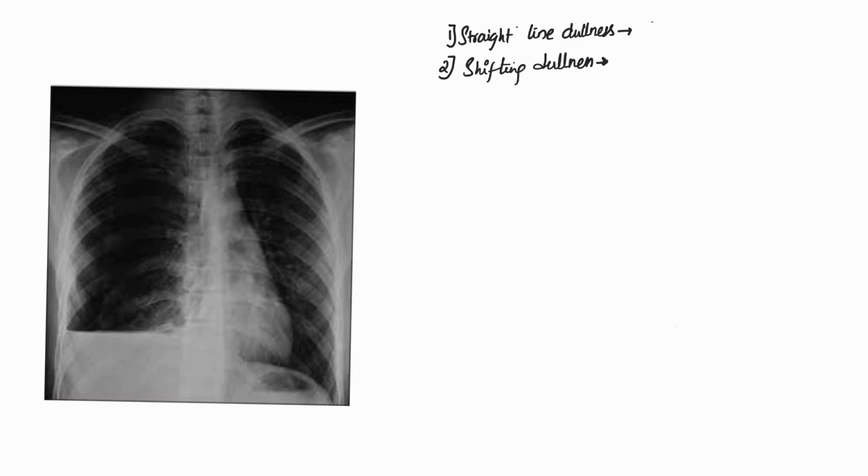Like let us say the patient is in a decubitus position, and this right side part is the diseased part, and because of this position, right lateral decubitus position, there is fluid collected on the dependent position, and you can clearly see the air is above.